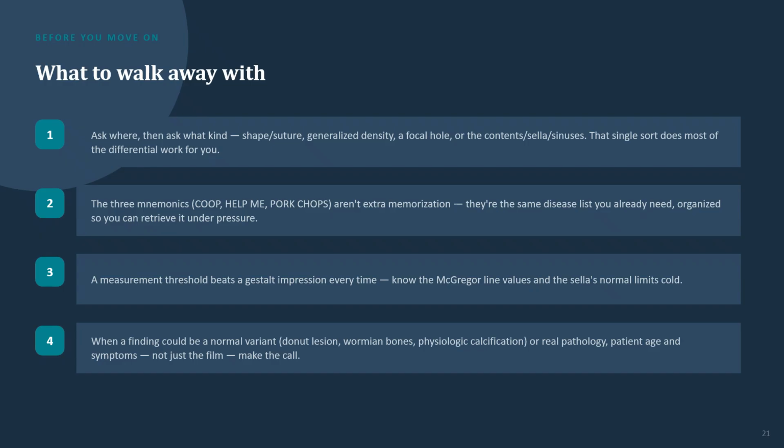So again, somewhat trying to identify the pattern first, although we're not memorizing any of these things, looking at where the location is of the pattern. Typically, we're not making measurements, but the radiologist will make measurements, thinking about or looking at their age and also some of the symptoms or their clinical history to kind of narrow down what the cause is.